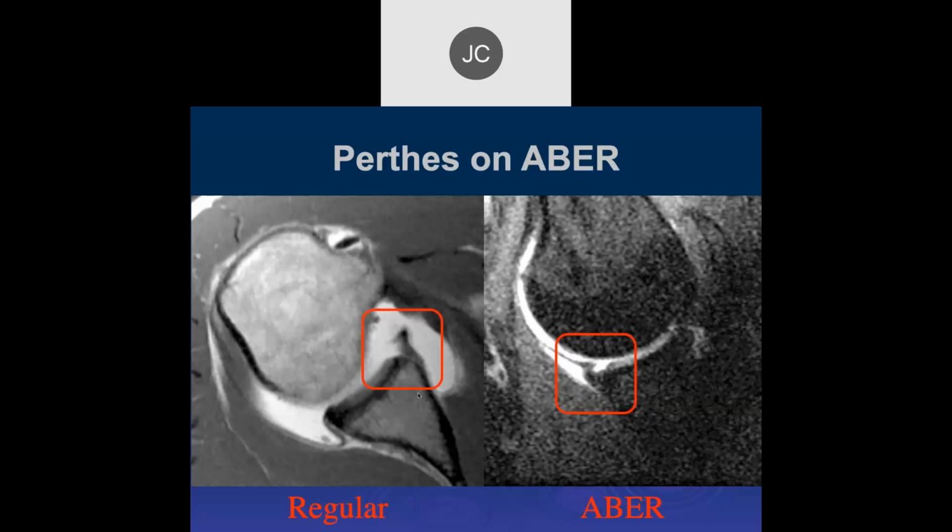Yeah, John? You have to remember when there's a dislocation, what you're looking at now is after reduction. During the dislocation, that tissue is peeled back quite a ways. I shouldn't say back, but anteriorly.